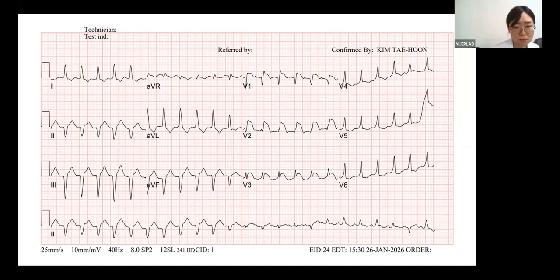What did you see? P wave? I see it clearly. So the later part shows a P to QRS relationship, right? Yeah. Right. But the part just before the end has some different morphology, as Q pointed out.